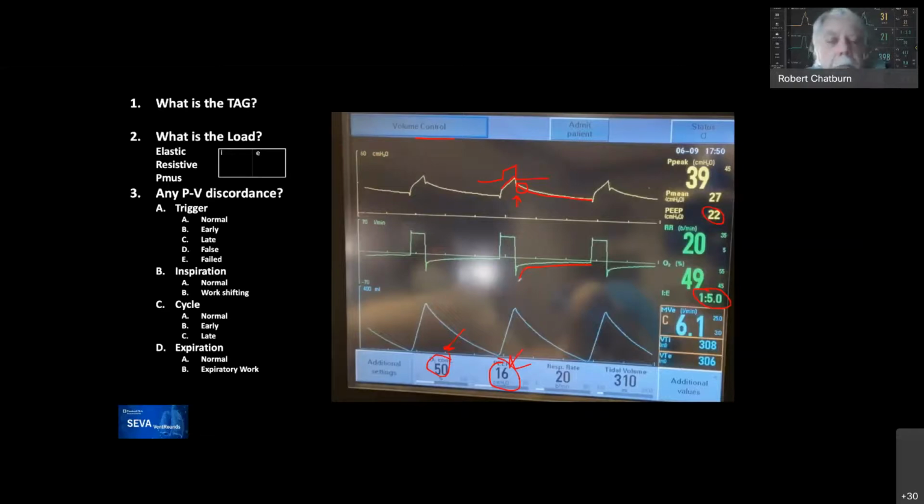example of how you can make that distinction, because the airway pressure waveform during expiration is strictly a function of the expiratory flow through the expiratory side of the ventilator. And generally, if that's a low resistance system, then that flow has very little obstruction. You go right back down to PEEP and you're good to go. So when you see something like this, you know that an external resistance from the endotracheal tube outward is causing this to happen and reflecting in the airway pressure.